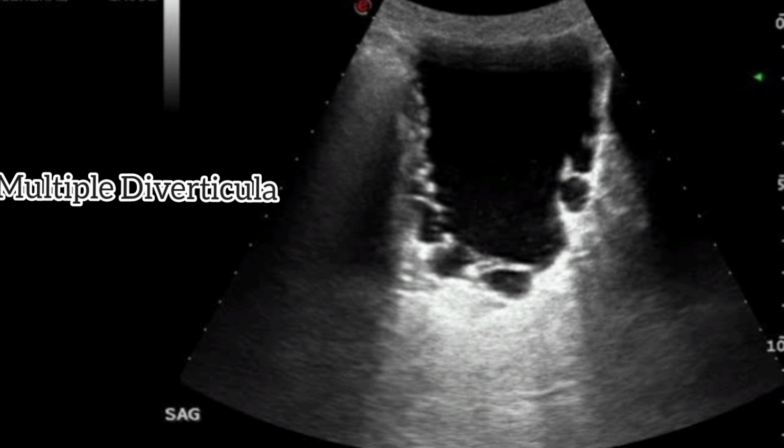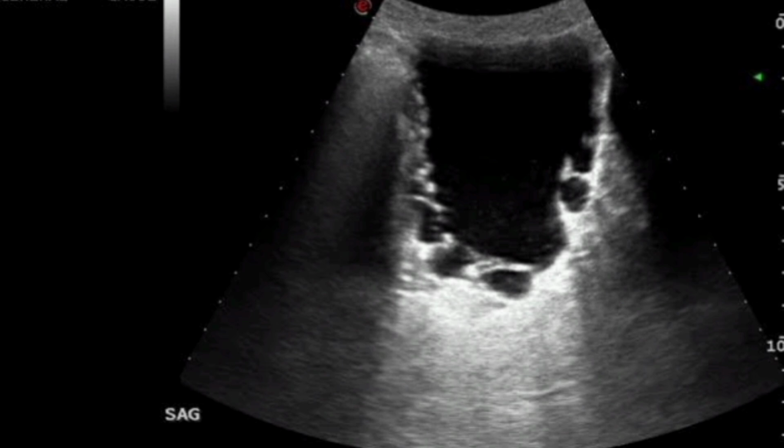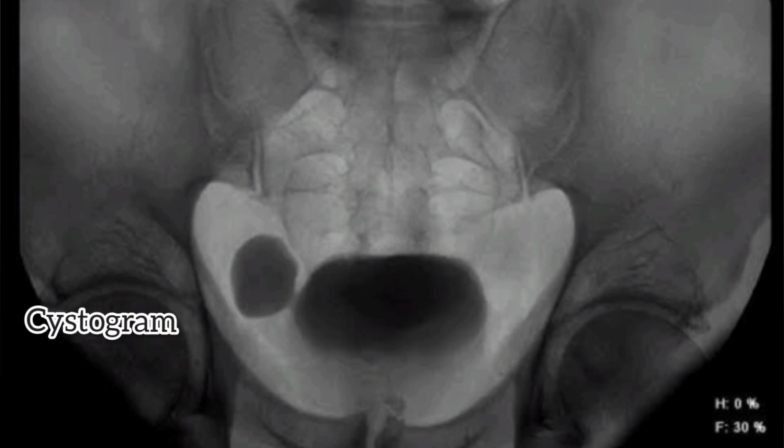So this is another example of the multiple outpouches, which are called the multiple urinary bladder wall diverticula in this case. And further, if we go for the imaging, like on the cystogram, we can see there is a contrast filled outpouching from the urinary bladder wall. This is a single diverticulum from the bladder wall. In some cases, there are multiple diverticula which are due to the persistent obstruction and straining of the patient.